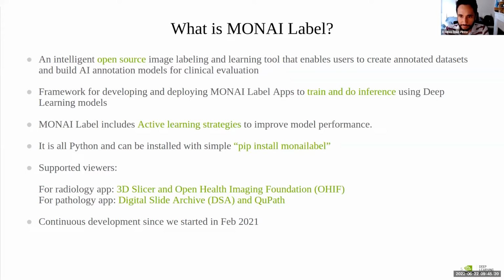Essentially, it is an open source platform that facilitates annotation of medical images. We started also with the pathology images. So we have both. The idea is to facilitate the annotation of both types of images, 3D medical images and histopathological images.